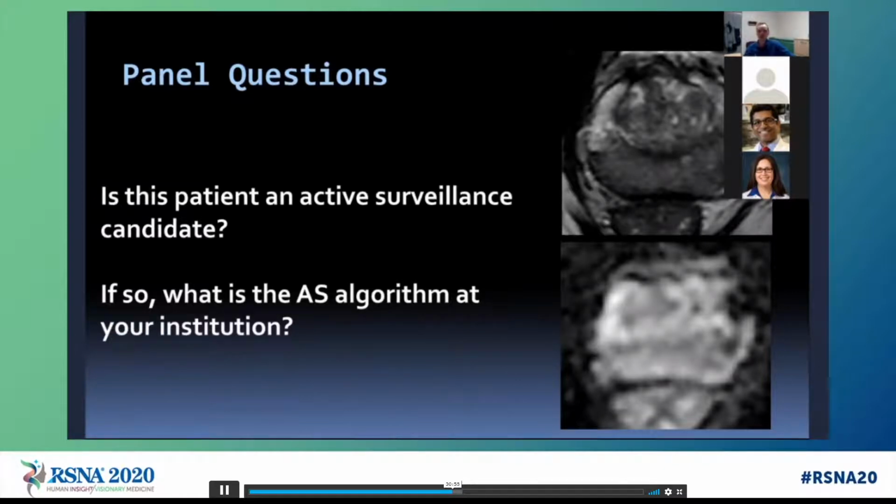So do we think when we review this MR that there is a significant lesion elsewhere in the gland that may have been missed by the systematic biopsy? So either the extreme apex or the anterior gland, or even posterior in the peripheral zone that just by sampling error may have been undersampled or missed. So that's a key question we have to answer.